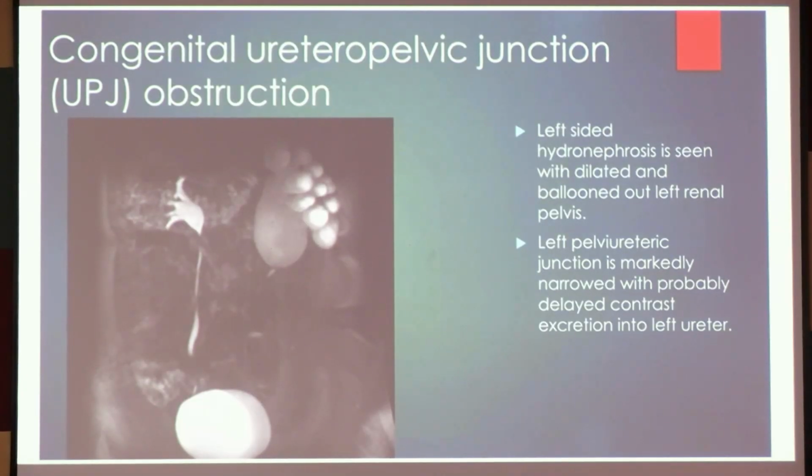This is what we need to understand here. Suppose if the ureter was also dilated, then the pathology would have been in the bladder. If the ureter is absolutely normal, if the ureter is completely thin, but the whole entire kidney is actually like a bag of water, in that situation the pathology is at the level of the UPJO. Okay. These are also having certain gradings.